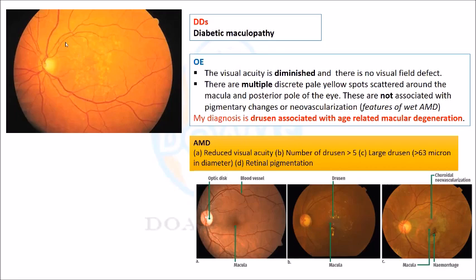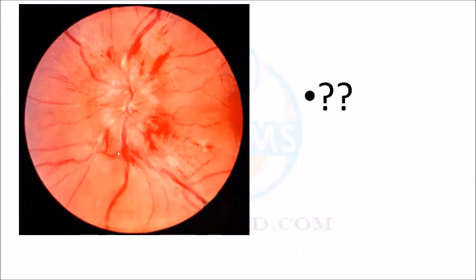So in this first picture above, are we seeing any choroid layer? What do you think? Is any choroid visible here? No. We are seeing only retina. These are the retinal vessels, and in the center, there is drusen. So if the degeneration progresses, then the choroid may be exposed. So this is that picture. Okay. What is this?